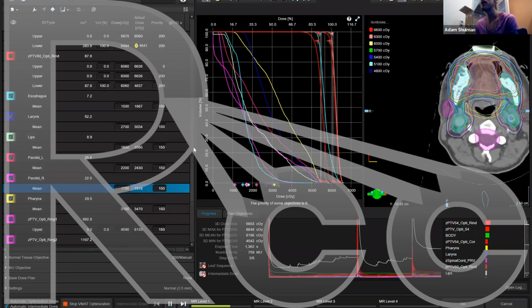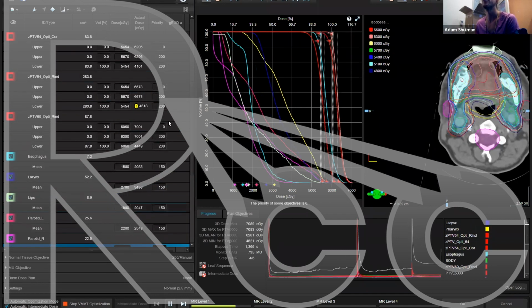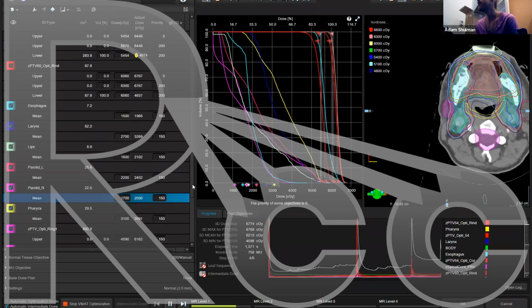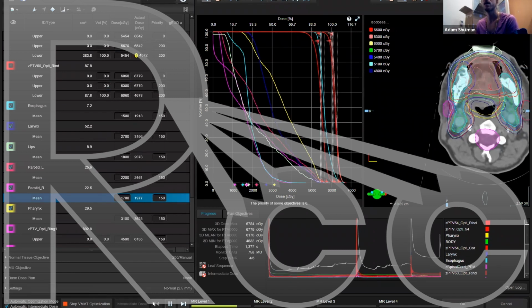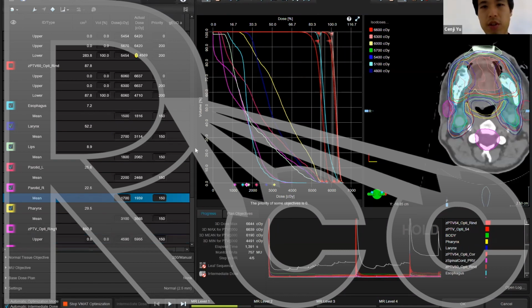But through trial and error, we found that if we start with targets at 200, NTO at 200, organs at risk at 150 and follow this process, it works well. If you want to deviate from that and you find something that works better, that's great. But definitely the process that we teach does work. So if you want to at least start by following this process, I'm pretty confident that you'll start getting some really good plans.